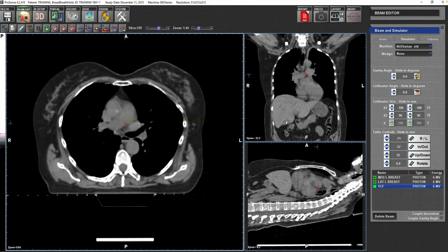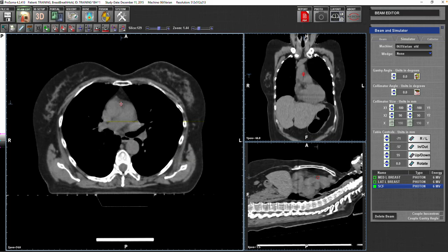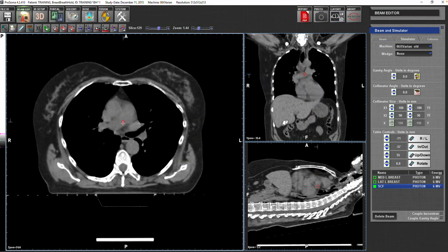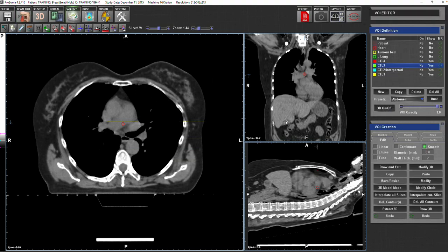node levels. So if you're now very familiar with what we talked about, like the arch of the subclavian and so on, then you'll understand what I'm talking about. When you start to delineate, I would start by rearranging them. So don't start by 1, 2, 3, 4. I would start by 4, 3, 2, and 1. And the reason why is because it leads to each other. One by one, we'll move on to give you the second one.